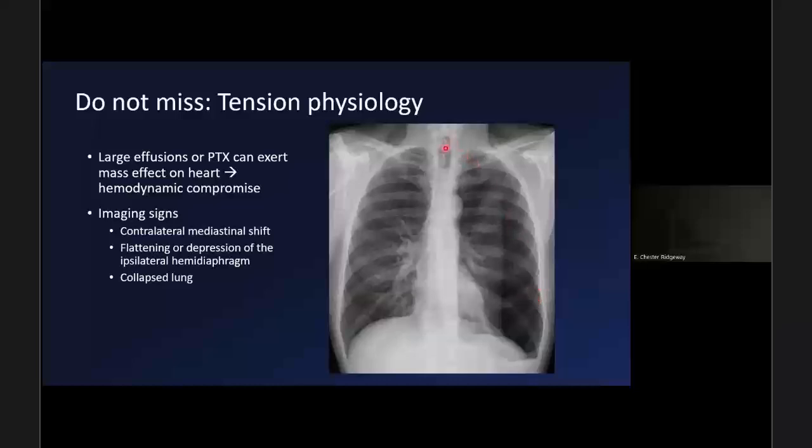So this is a patient with a spontaneous pneumothorax. Notice how most of this lung is collapsed. We have flattening and even some inversion of the left hemidiaphragm. The mediastinum is pushed slightly towards the right. So in this case, I would tell the provider, go get an echo, make sure this person is okay. They would get a chest tube regardless, just based off of the size of the pneumothorax, but the urgency behind it is kind of where the importance comes in.